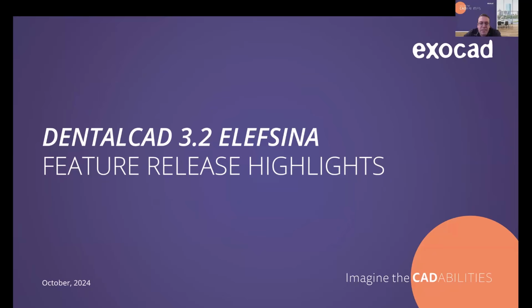Before we get started, the topic for this one is the bite splint workflow. Before we get into that workflow, we're going to talk about some general features and workflows that are included in the latest release. Usually these minor in-between releases are service releases, but there were enough new features and tools that we were able to put in this version that it earned the name feature release. So first we're going to go through some of that new stuff that's in here.